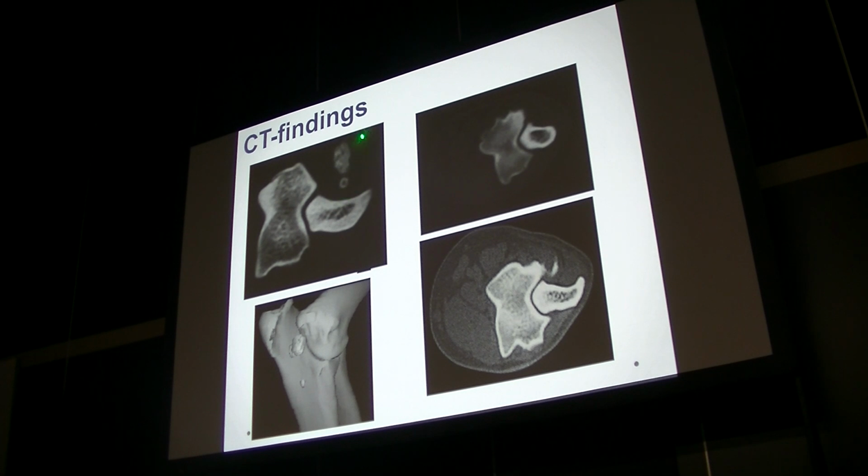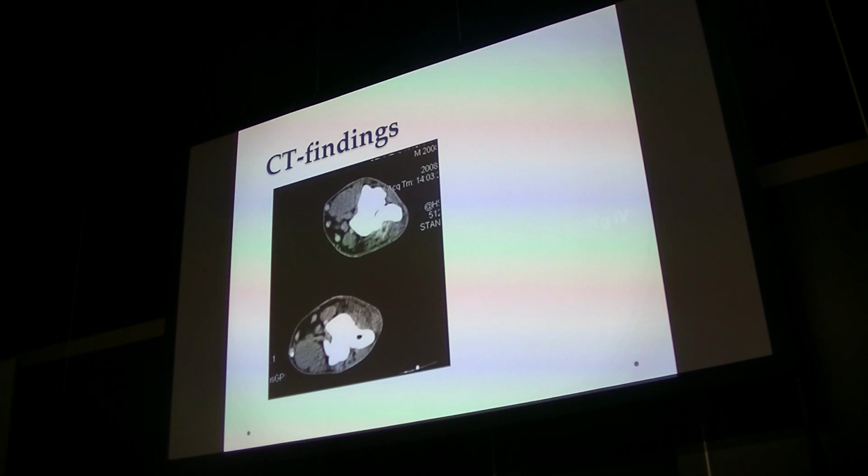Also, the calcifications are nicely visible for sure if we make a 3D image. The calcifications can be quite large. Here a discrete case, some new bone formation at the medial side, sclerosis, and a small calcification in the attachment. So about the application of IV contrast, in those cases there's an inflammation in the tendons and attachments, as we are sure of, as we know.